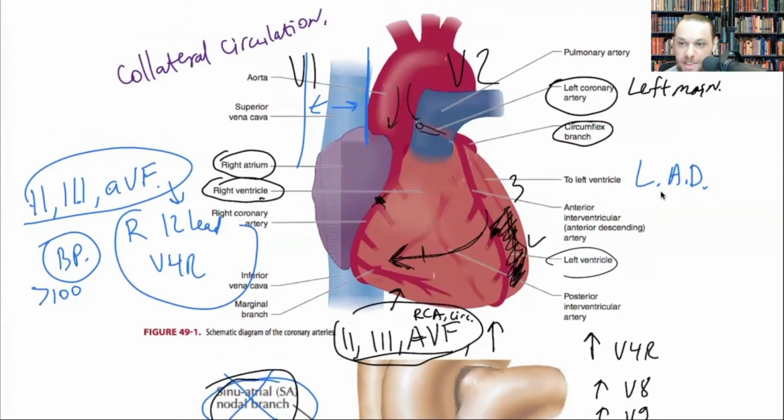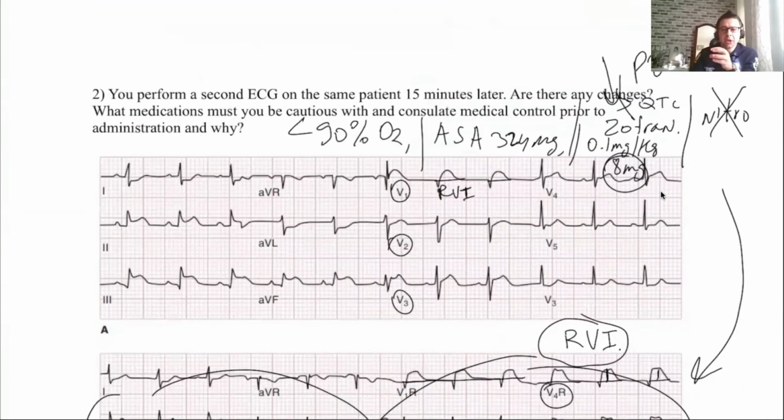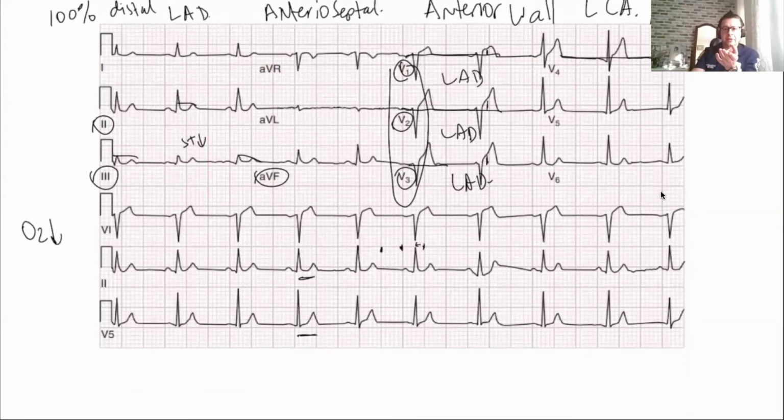However, if your MI is not so large that you have very high ST segment elevations, you may not always have reciprocal changes. Right. So basically, if the infarction is in that portion, the ischemia and injury are going to just go around it, and that's what's manifesting, right? Yeah, exactly.